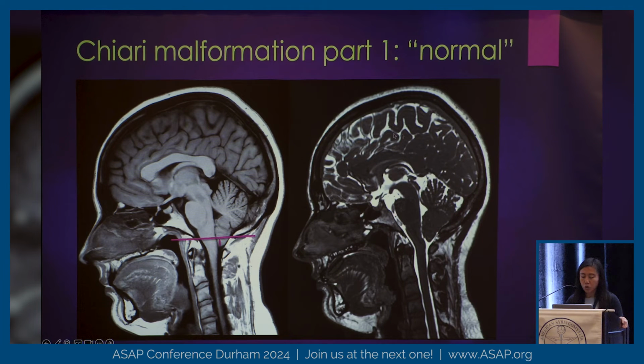This is a sagittal T2. It's a thinner section called a 3D T2, and it offers different advantages. So I can see a lot more detail in the brain parenchyma, and I can maybe see a little bit better in the cerebellar folia, but as you can see, the bone is a little bit harder to guess exactly where it ends. I can see the CSF really well at the cord level and the craniocervical junction, but I still think the measurement is better done on sagittal T1.